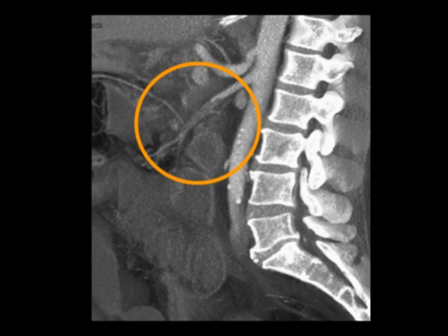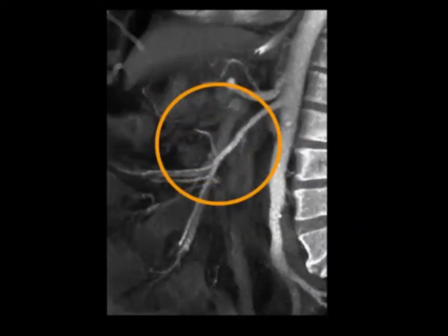Then you see thrombus. So here's an example of thrombus of the SMA, but the patient does not have any true plaque in the vessel. And if you were looking quickly at the vessel, you would say it looks good. It's only further down that you appreciate the thrombus, and that's where sagittal works so well. And here's that same patient a week later. They went in, removed the thrombus, and now you see perfect flow and just a really good visualization of that patient's vessel.